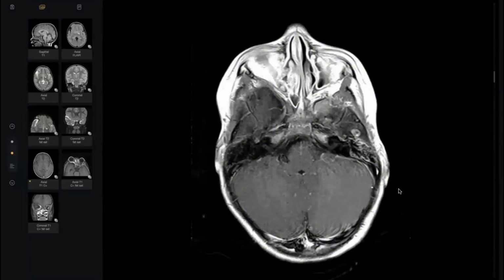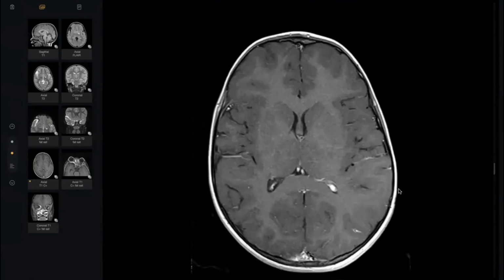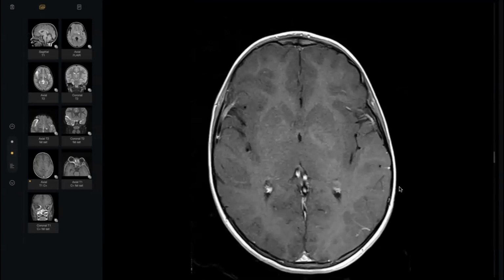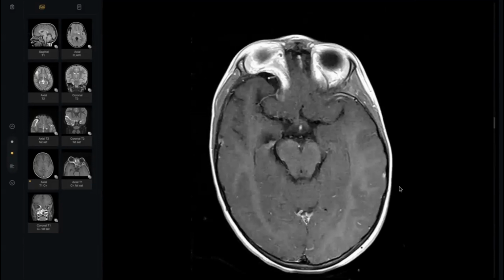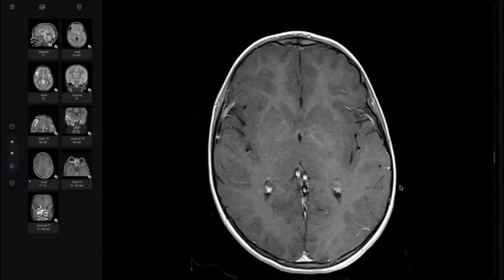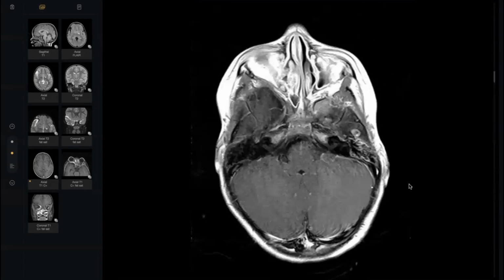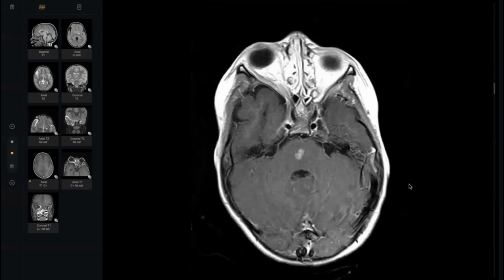What is the name of these lesions? The supratentorial lesions. What is the name? Give me a differential diagnosis for these lesions. Because in the context of neurofibromatosis type 1, this could be astrocytoma versus other lesions could be those of ependymoma. No. What else? Do you hear about FASI? Yes, I know the FASI. Okay. Which is focal.